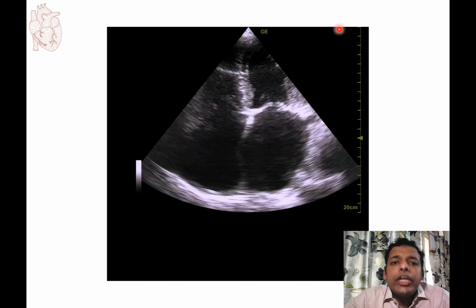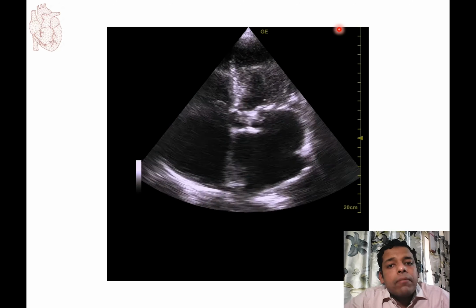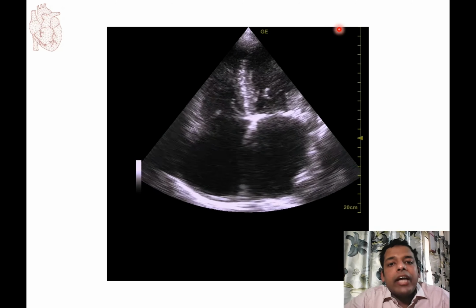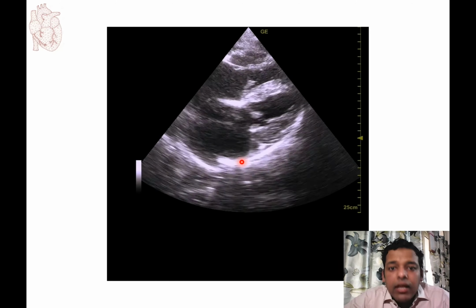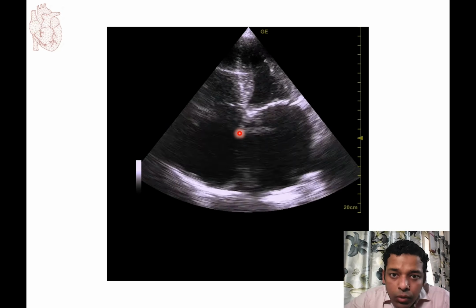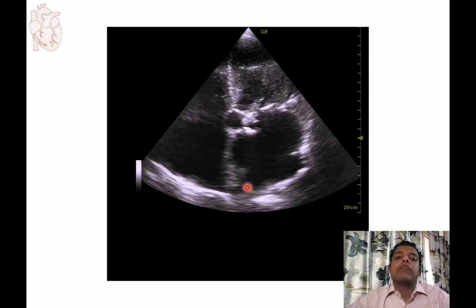Thus, changes in the left atrium dimensions and volumes mirror the continuous process of filling and emptying. Bowing of the atrial septum into the right atrial cavity indicates left atrial dilation and/or elevation of the left atrial pressures, which is most easily appreciated using this apical four-chamber view.